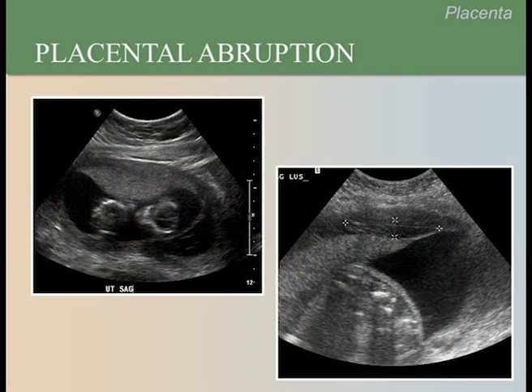This is how placental abruption might appear on ultrasound. There is an abruption in each image. Please ask a participant to try to identify the abruption, which can appear behind or next to the placenta as an isoechoic or hypoechoic fluid collection. If the bleed has recently occurred, the fluid may appear hyperechoic.